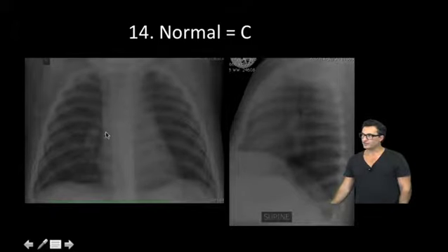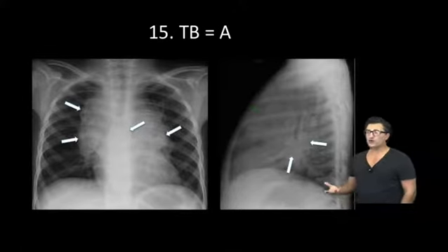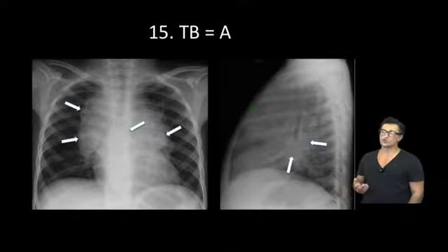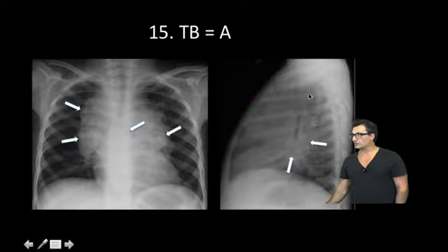I think this is a vessel, and there's an open mouth of the hippo. I don't see any oval masses on the lateral. And now for the last X-ray. Of course we have masses at the hilar, and of course we have mediastinal masses, and of course these are visible on the lateral also.